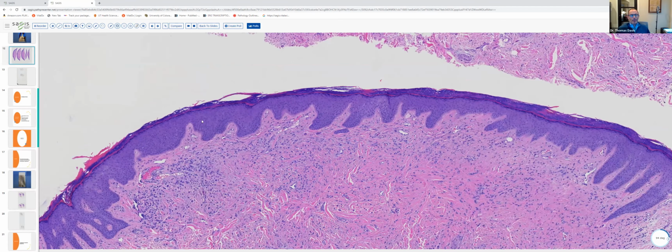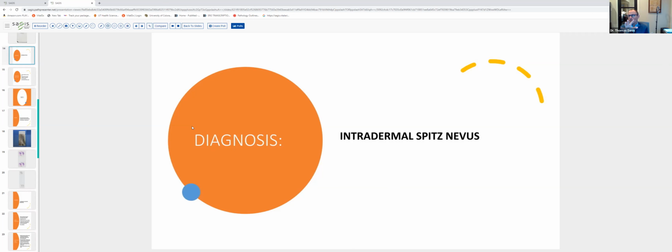Now, obviously, like any melanocytic nevus, a Spitz nevus can be junctional, it can be compound, which is what we see most often and which is what usually shows up on an examination, or they can be intradermal. And the intradermal ones, one has to have a fairly high index of suspicion for. Like most Spitz nevi, they do tend to be composed of enlarged, spindled, and epithelioid cells.